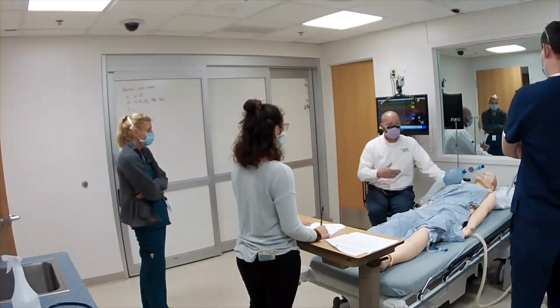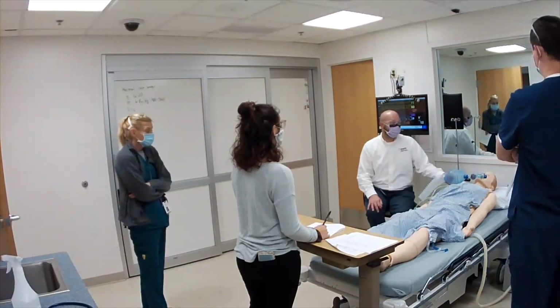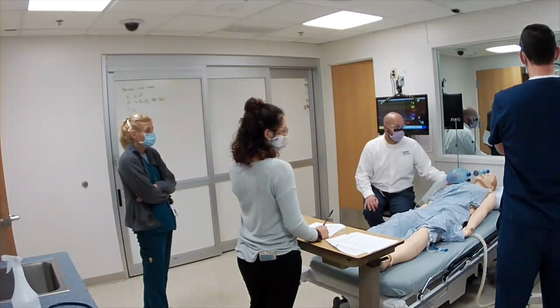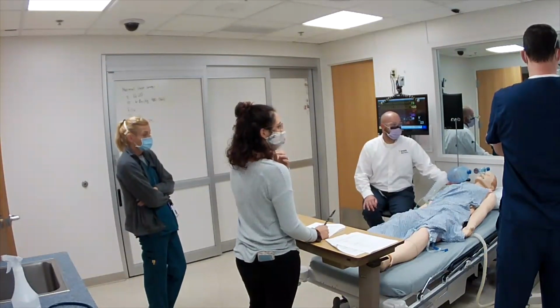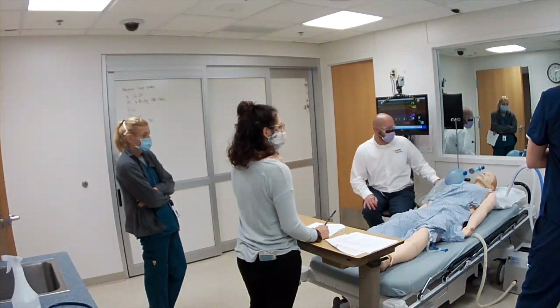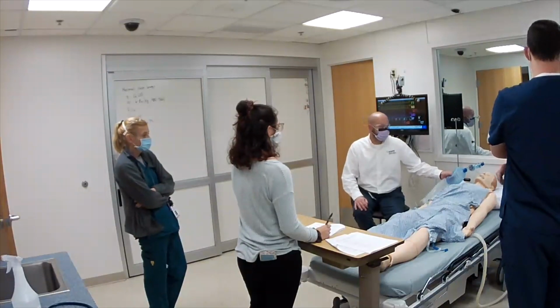To be quite honest, I don't really turn that one much. So that's your inspiratory pause, right? That slight pause, you go up, and then down, right? Does that even show up? And then next you have rise time, which is how fast we're going to run that air in, right? Okay. What about trigger flow?